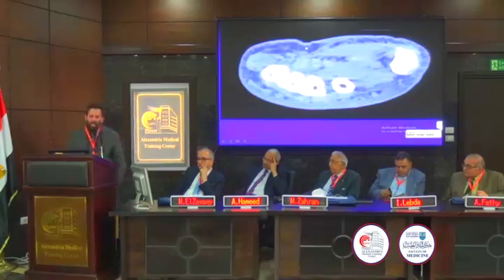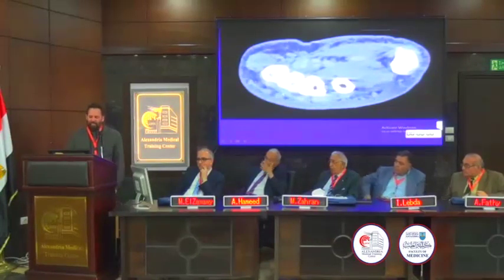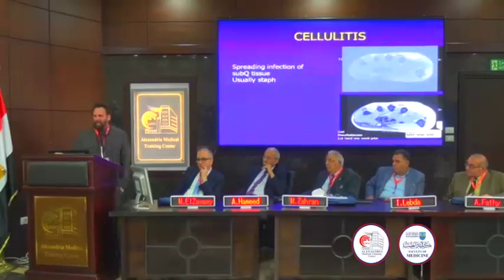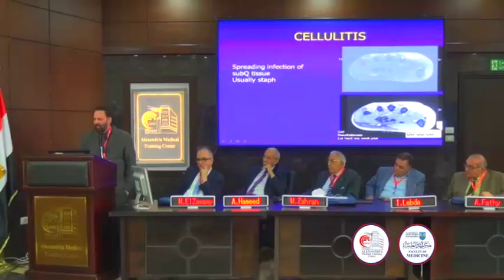So this is going to be a lot of soft tissue swelling with cellulitis. And on CT, you'll see thickening of the skin. Your normal dorsum of your hand skin should be like parchment thick, like papyrus, perhaps. And then deep to it, when you get cellulitis, you'll get edema and replacement of the fat. So X-ray of cellulitis, CT of cellulitis, MR of cellulitis, the same thing: thickening of the skin, edema in the subcutaneous tissues, enhancement, and it looks like it's spreading.